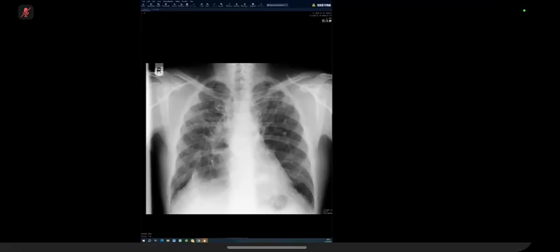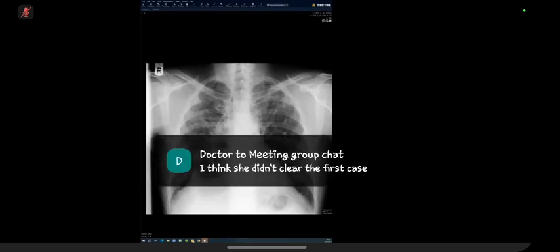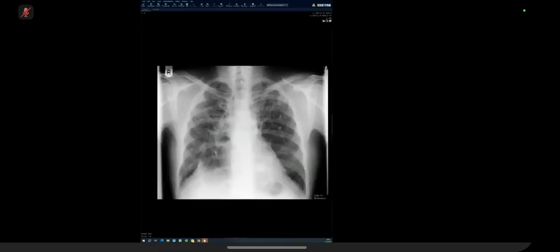I'm looking for the causes like sarcoidosis. I'm looking for any hilar lymph nodes. Then tuberculosis. I'm looking for any apical opacities. Then another cause is radiation, but there is no specific pattern of involvement. Another cause could be ankylosing spondylitis, so I'm looking for any calcification of the interspinous ligaments, which I would like to window for appropriate viewing. And another cause could be drugs, so I will inquire with the patient for any history of drug exposure. Okay, well done. That was so much better than the first time.